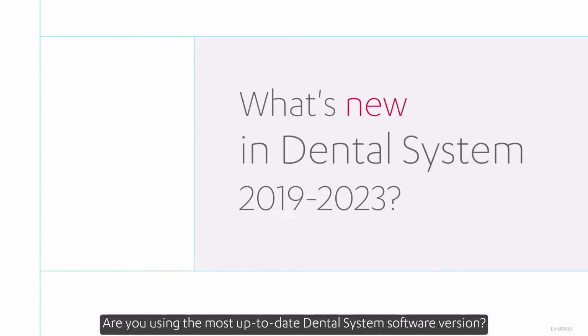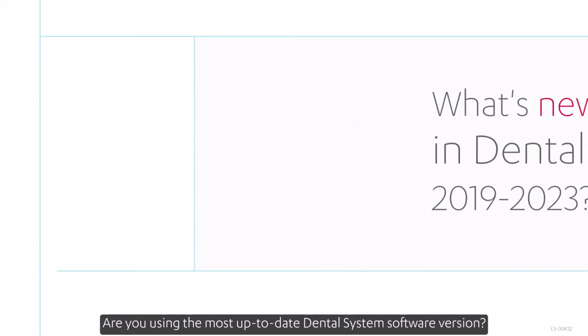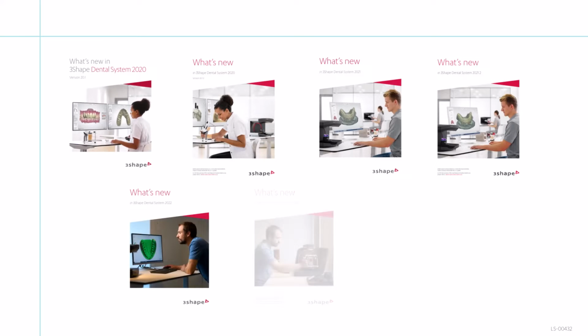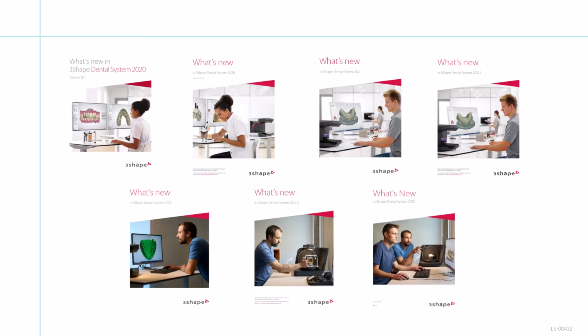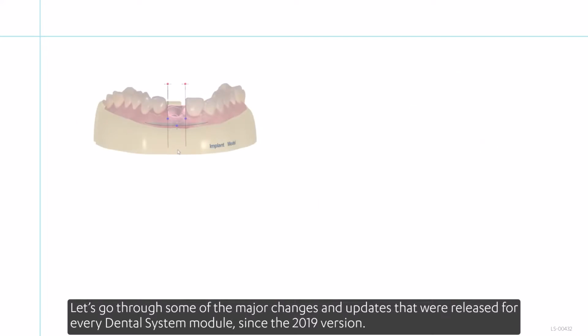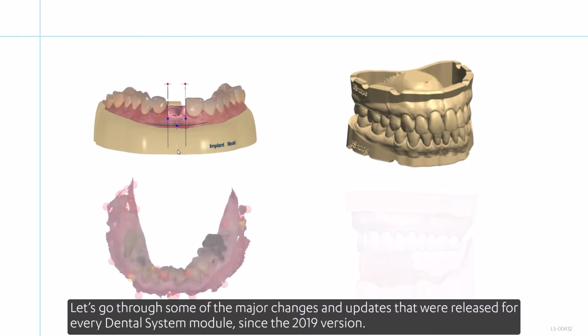Are you using the most up-to-date dental system software version? Over the last few years, we've developed and released plenty of updates that can make your lab work easier. Check if you are aware of all of them. Let's go through some of the major changes and updates that were released for every dental system module since the 2019 version.